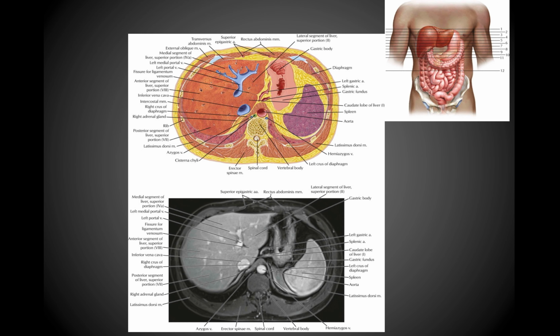All right, moving to the next level, again, you can still see the diaphragm sort of overlaying the aorta at this point. You can see the spleen quite well, the stomach. You can see some vasculature here coming off of the abdominal aorta. So you're looking at the splenic artery and the left gastric arteries. Both are just kind of coming up into view, kind of a cross section through just a smaller segment of those vessels. And then here, sort of in the midline, we're looking at part of the portal vein. So again, you can see that outlined right through here quite well.